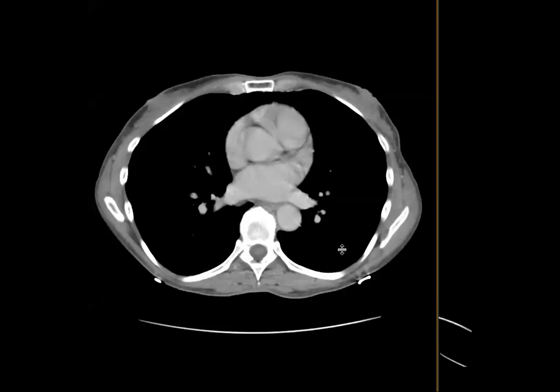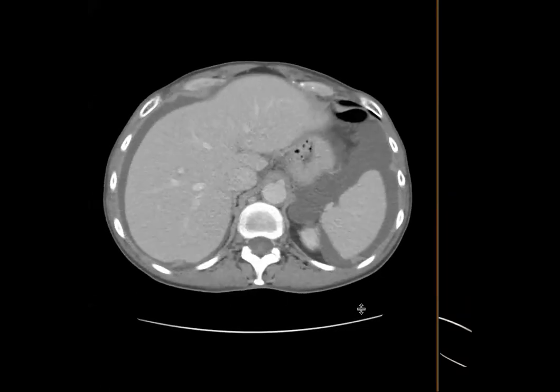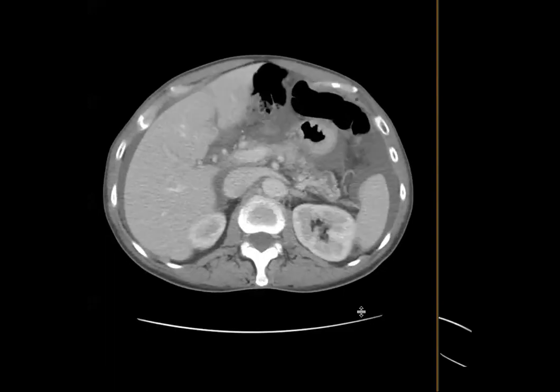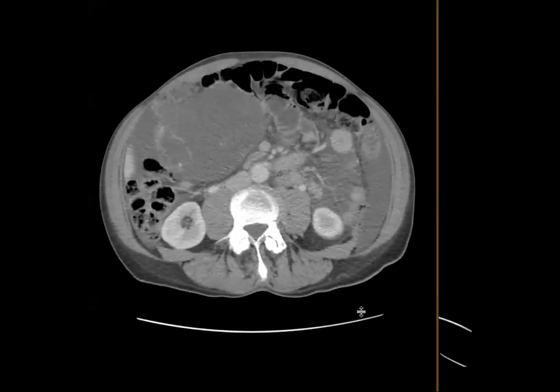All right, this one again is for you guys, and I'm going to scroll through, not an eye test, but look at all the findings and tell me what you think. I'm going to go slow. This is a woman.